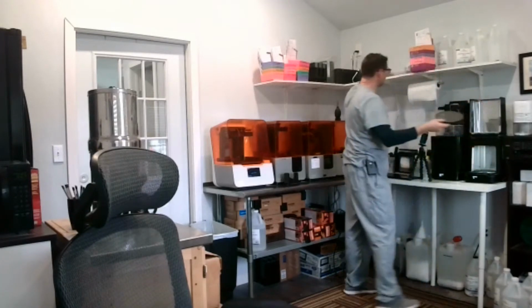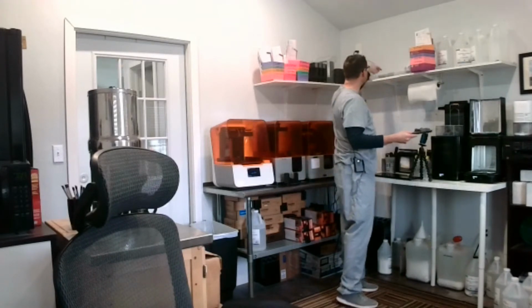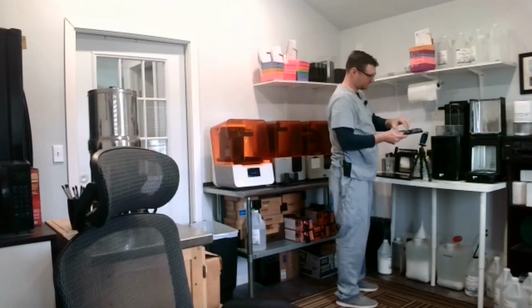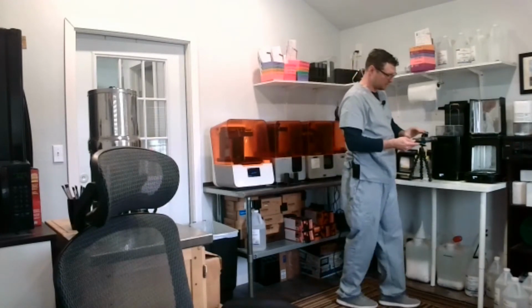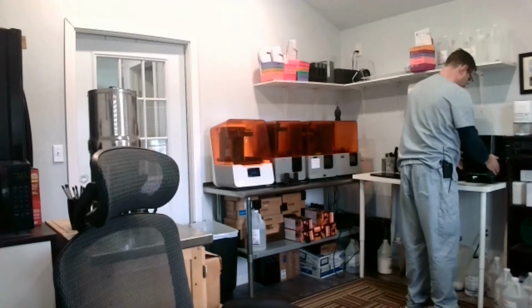I'm going to take my little rotisserie, I'm going to put my models on it. Hopefully y'all can see that from there. Again, all my batteries died. And there we go. I just put them in there, spread them all apart so you can see, so that the lights can access all the surface areas.